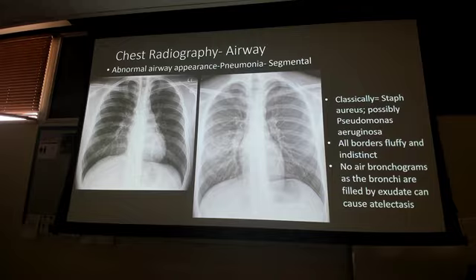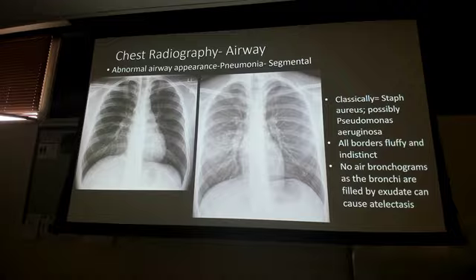And then the biggest one between this one and some of these alveolar ones we talked about is the air bronchogram, right? This is how I know this is segmental or interstitial as opposed to alveolar. I don't have those air bronchograms. I can't see that radiolucent tree branch. So that tells me we haven't quite gone to alveolar edema, and this is more of a segmental type thing. Sorry, I used interstitial wrong, but that grainy sand is your interstitial, those immunocompromised patients.